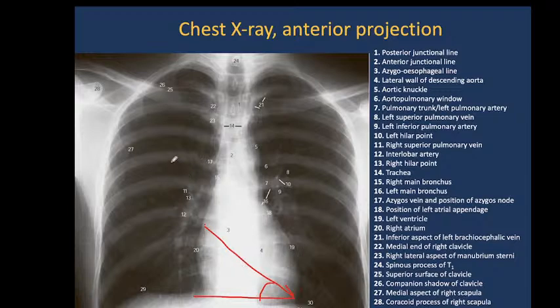Another interest is to see the lungs inside of the chest. Usually we see some shade, some structure located close to the mediastinum.